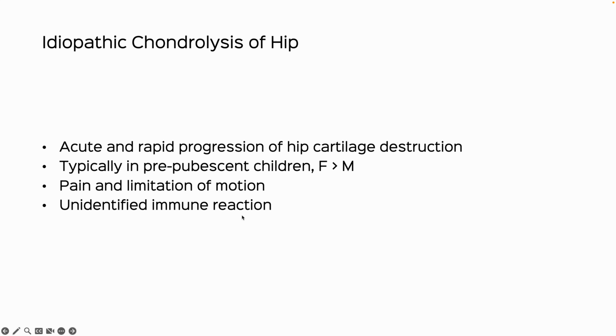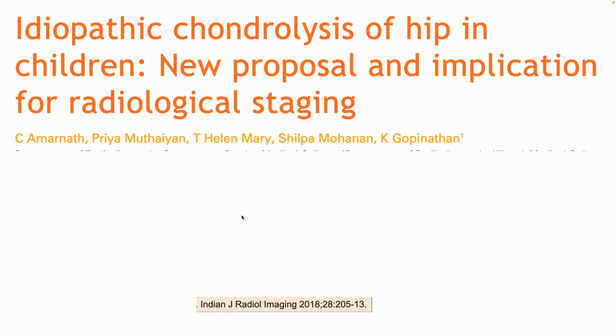So we don't really know much about it. We don't know why it occurs. We don't know why it occurs more on the right than the left. We don't know why it occurs more in women than men. But we do know to some extent how to recognize it.